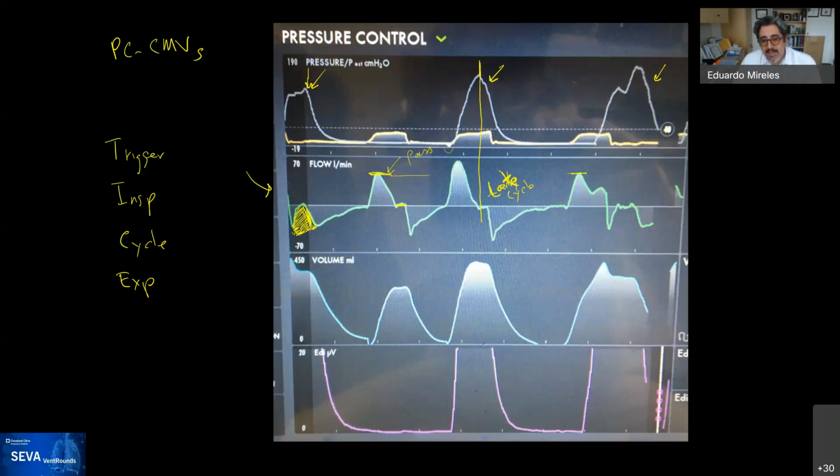And then the early trigger occurs. The ventilator triggered early, then the patient did, so it's an early trigger. The patient starts pressurizing, and as the patient generates pressure, there is this bimodal EDI, which is a known cause of double trigger in NAVA, but we're not going to get into that.